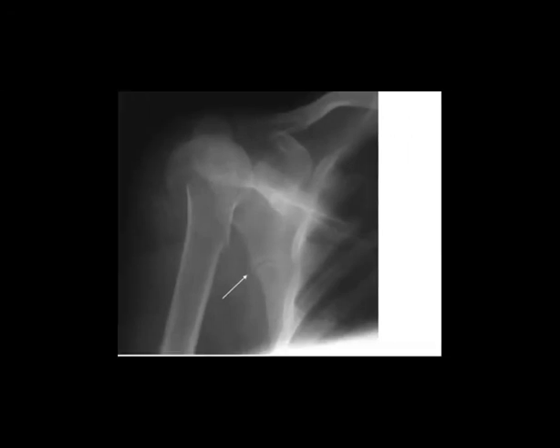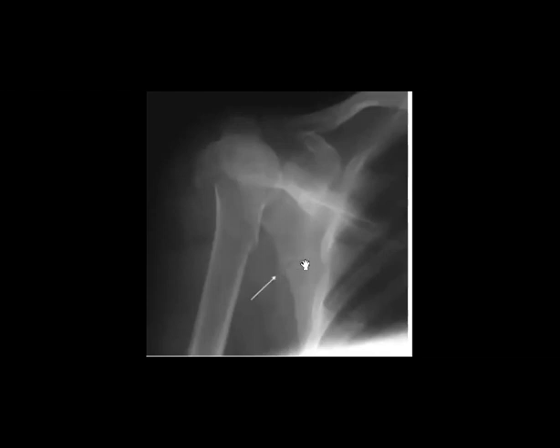So you can see easily this, what is called Looser zone, and also the axillary border of the scapula or lateral border. Sarah, perfect. Nermeen, Marwa, thank you. We mentioned the femur, the inferior pubic ramus, also the ribs, and the acromion, and finally the ilium.